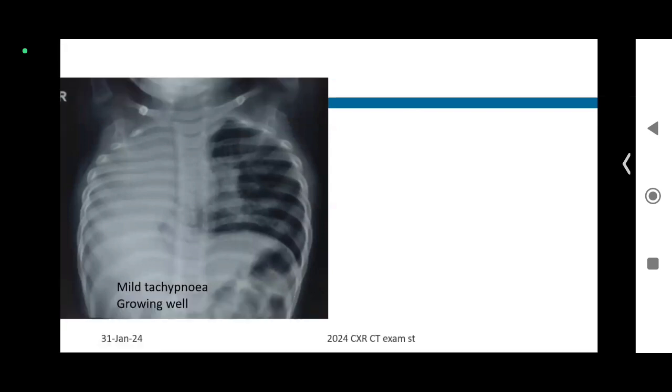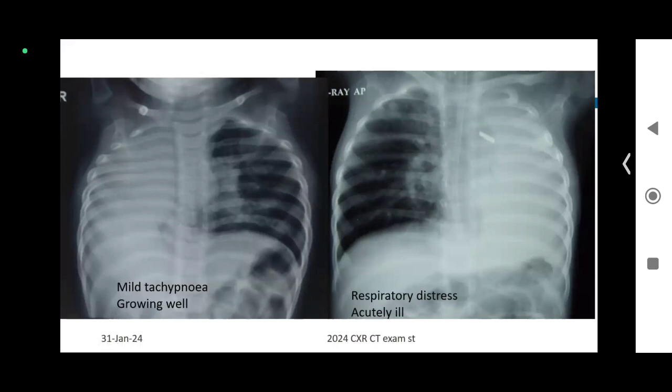If the child is in distress, then you know it is an atelectasis. This child has got respiratory distress with absent lung markings on one side. You have something else here also. This is a child who had a PDA clipping. Unfortunately, once upon a time in PDA clipping, this clip was more than the size of what the thorax can hold. So it led on to atelectasis. Apart from clipping of the PDA, it caused pressure effect on the left main bronchus and the lung collapse. So this is an atelectasis of the left lung.